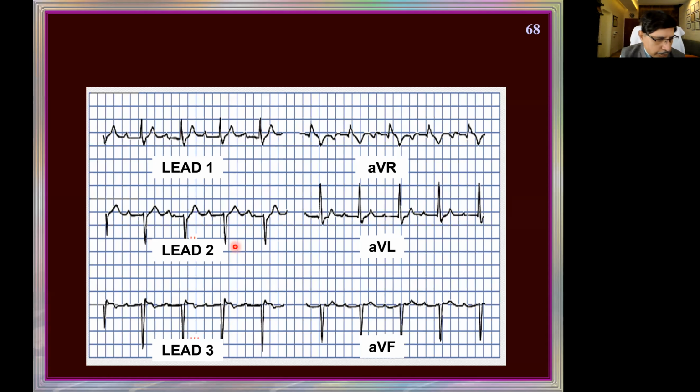Now, look at this ECG. First of all, tell me the rate. What is the rate of the heart? So let's say this has fallen on the thicker line. This is the 300 line, 150 line, 100 line, 75 line, 60 line, 50 line. It is not below 60, but it is 60 to 63 like that. 300, 150, 100, 75, 60. Heart rate is around 60.